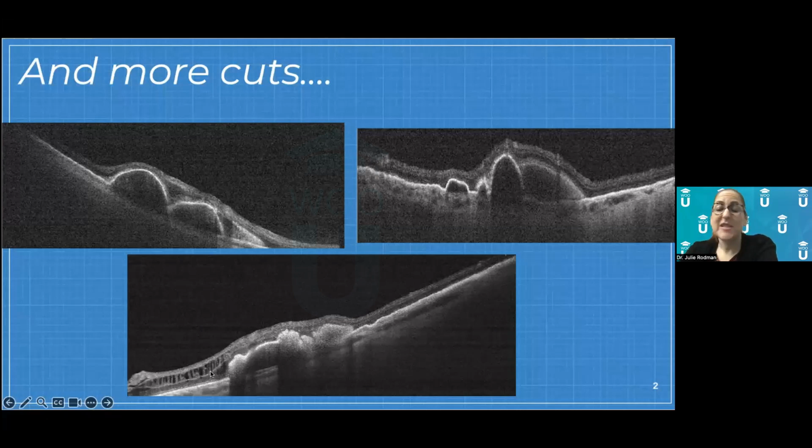So man, these OCTs are loaded, right? There's lots of stuff going on. Kind of ruled out what I had initially thought, that there was maybe a melanoma or some type of malignancy, because this is certainly pigment epithelial detachments. So it helped me, let's say it helped me rule out the really, really bad, but it was an anomaly that, what kind of disorder could cause these OCTs.